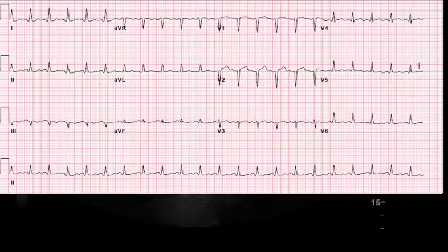Right here, you're seeing an EKG of a patient who came in with chest pain. Patient was in their 60s, had left-sided chest pain that traveled to the shoulder, no jaw pain, no shortness of breath. Patient didn't see a physician and so was not on any medications, but had no history of coronary artery disease, PE, or any other significant illnesses.